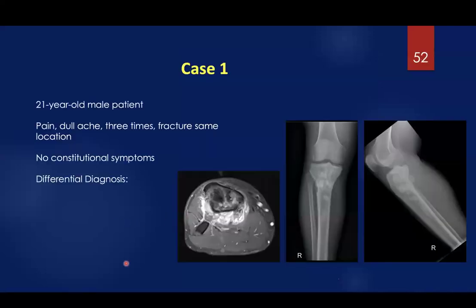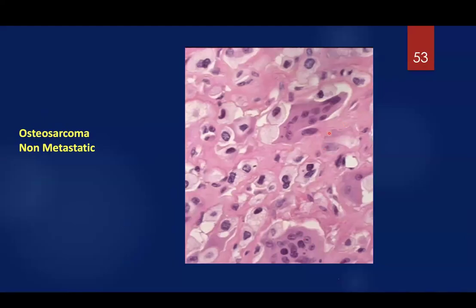Now, let's go back to this X-ray. I know from the clinical history this young patient in the second decade of his life had chronic pain, and the X-ray shows a permeative pattern of bone destruction and ossification. So in my mind, this is osteosarcoma. To me, it's an added point to prove that my thinking is correct. We're not here to test your knowledge in pathology.